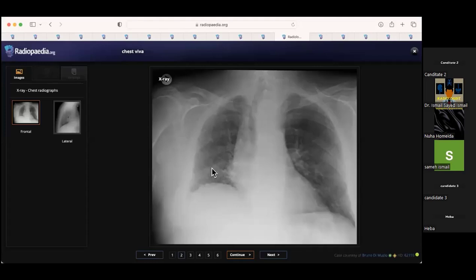Okay, the hilum is fine. If I tell you the hilum is fine, yeah. You've seen unilateral changes. You've picked up nicely that there is reduced lung volume and some increased interstitial marking, and it's only one lobe. So what would you do next, or what would you be thinking of?